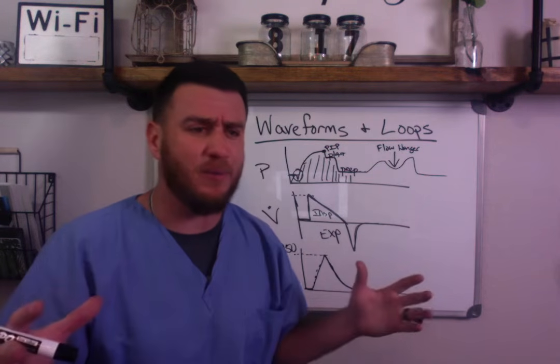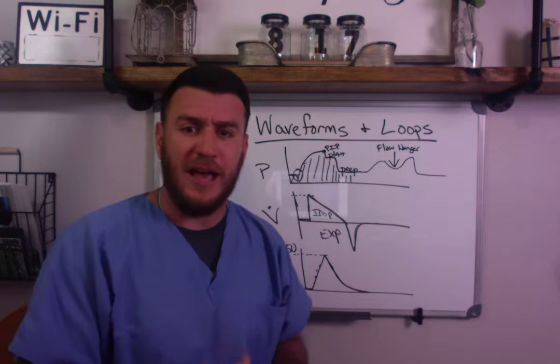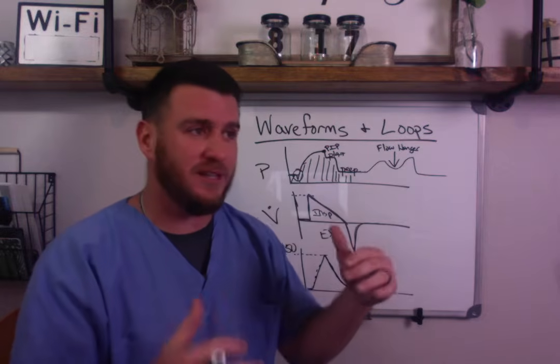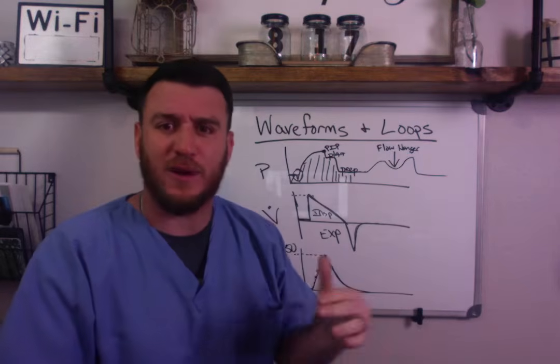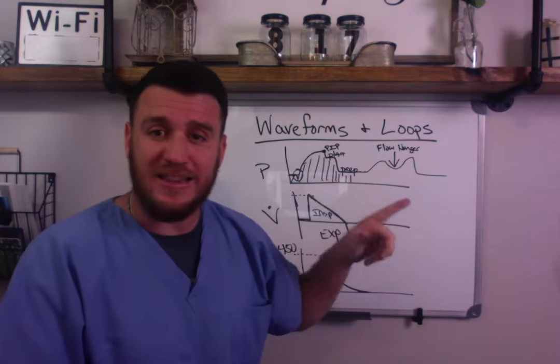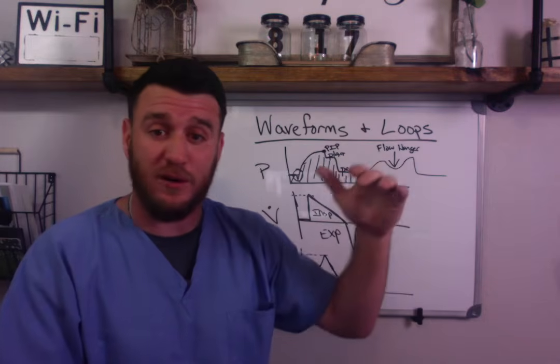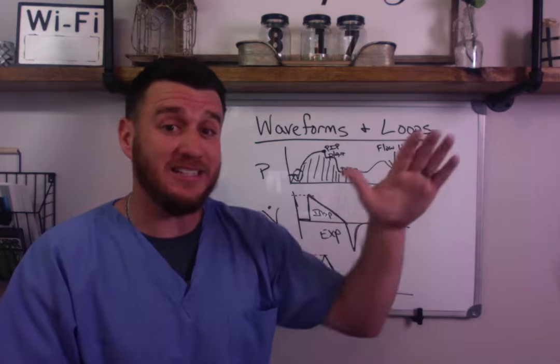Now, if you have a patient not breathing at all, and their diaphragms are still, and you take somebody's flow up from 45 to 95, of course their peak inspiratory pressures are going to go probably extremely high. So I'm not recommending that. What I'm telling you is that when you find somebody flow hungry and you see this, then you need to give them more flow. And you will find that through increasing your flow, you don't get a rise in your peak inspiratory pressure. You're actually going to get things to settle down.